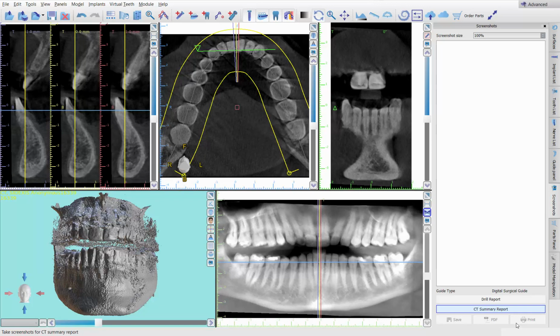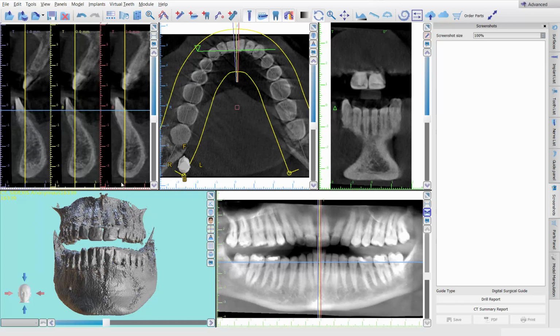So in this case, I'm going to bring in the lower arch. Anyways, let's go ahead and move forward with it. By the way, at the end of the video, I'll explain more of the why this works. But at the beginning, I'm just going to show you how. That way, if you don't care about why, you don't need to mess with that.